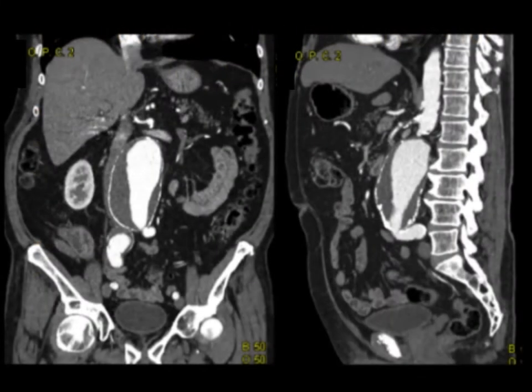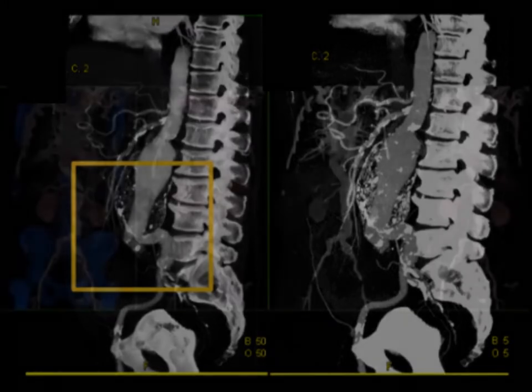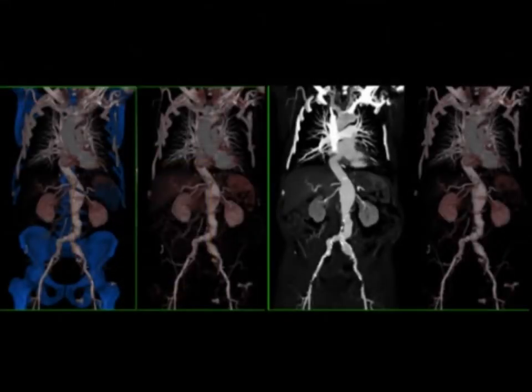When you have an aneurysm like this, there's no doubt that following may not be the great strategy. You can see here the size and you can see the angulation, but in this case, this patient needed surgical repair. The patient could not get endovascular repair because of the sharp angulation in the patient's abdominal aorta just above the bifurcation. In other cases like this, you can see the abdominal aortic aneurysm, which is almost bilobed. You can see involvement of the left common iliac.